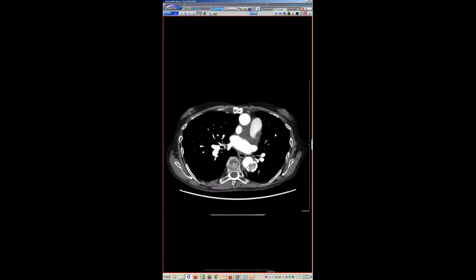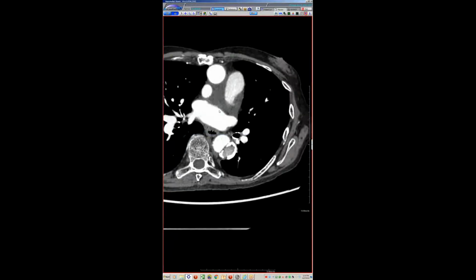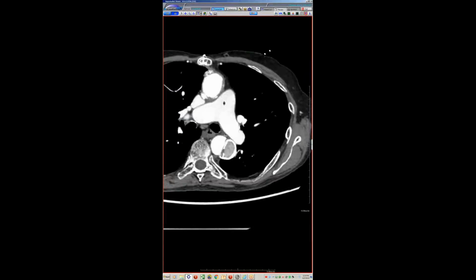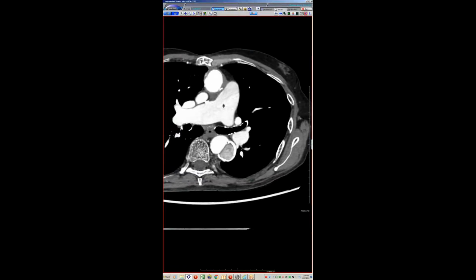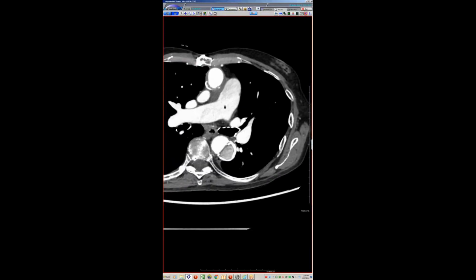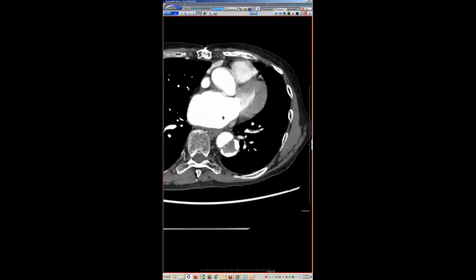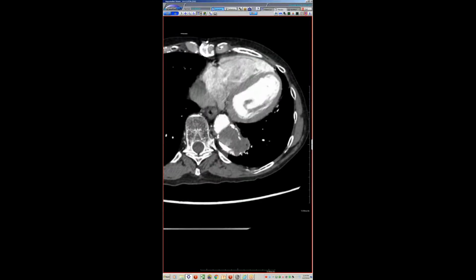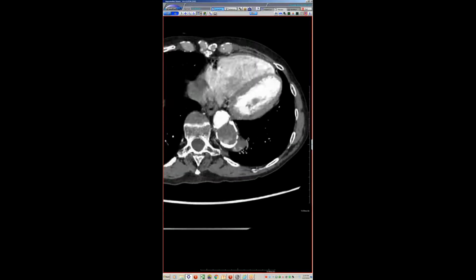And it's just an interesting CTA of this very calcified, chronically calcified false lumen. It's interesting to think about how these things occur with the intimal displacement anyways. And then here is that defect. So that defect had gotten much larger, but they're not too concerned.